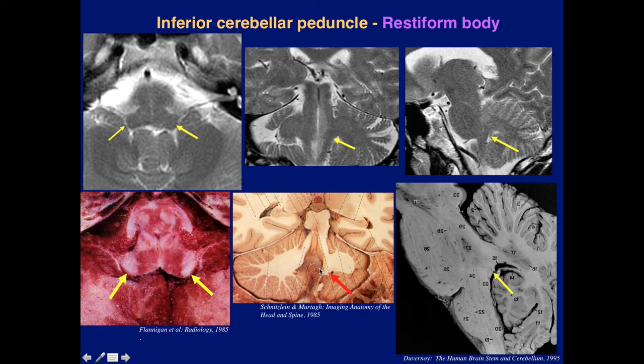And again, the inferior cerebellar peduncle is well seen on a sagittal T2, on a coronal T2, and here on the axial T2, where it's easiest to see. That's the region of the inferior cerebellar peduncle, and you can always identify it because the eighth nerve travels from the IAC towards the inferior cerebellar peduncle where the nucleus sits, the auditory and the vestibular nuclei. And notice nicely the inferior cerebellar peduncles here on the axial specimen.